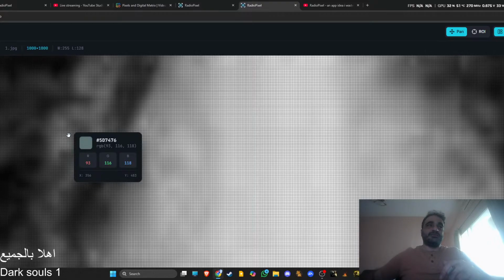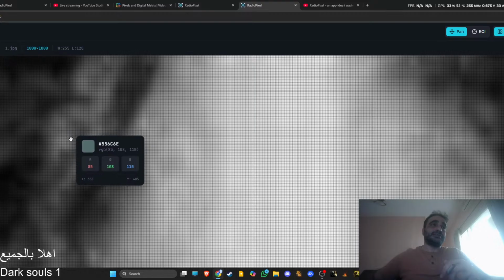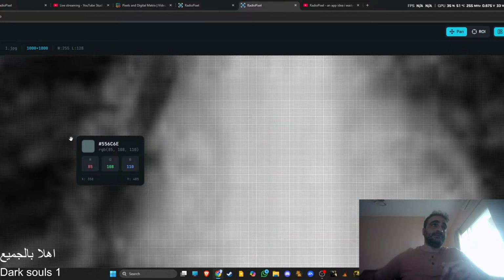Honestly, this is the main idea of the whole app. For each pixel, for example, this one, #556C6E, I think it's called the hex code, the RGB distribution of this specific pixel.